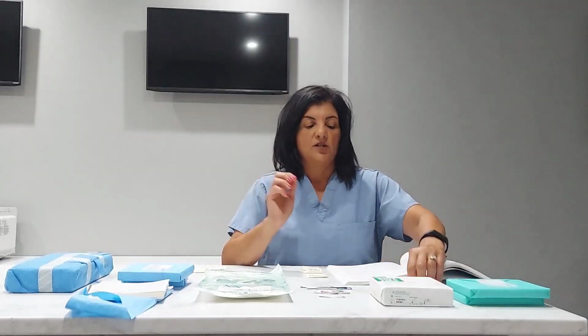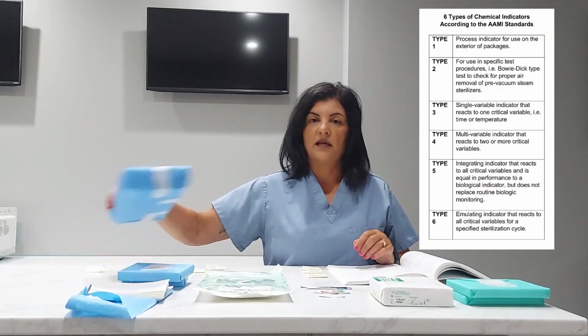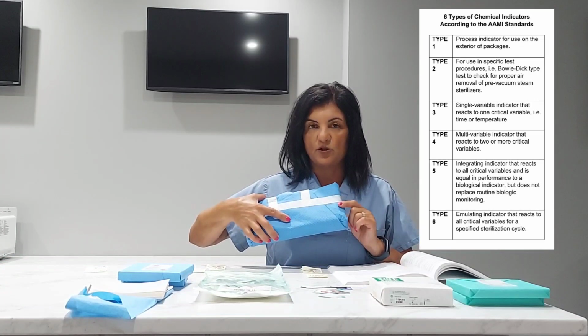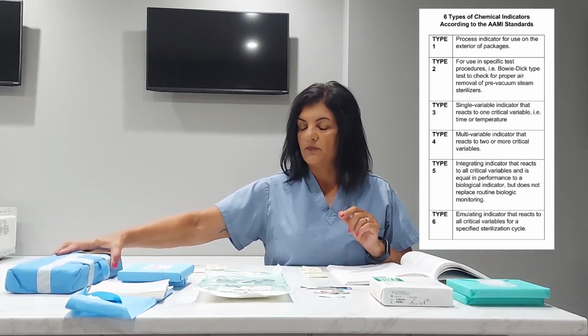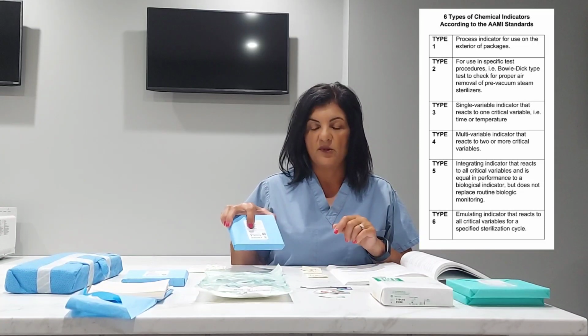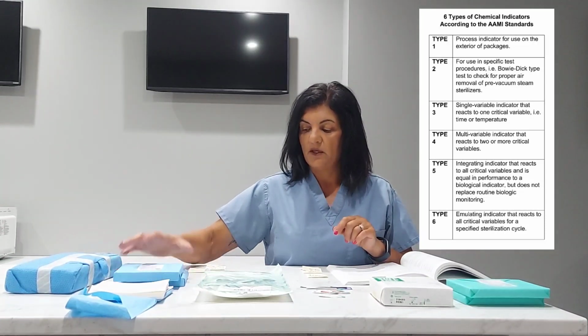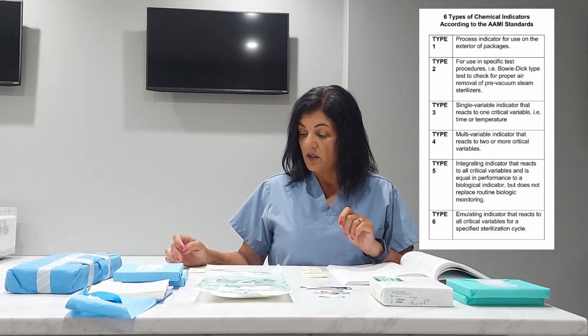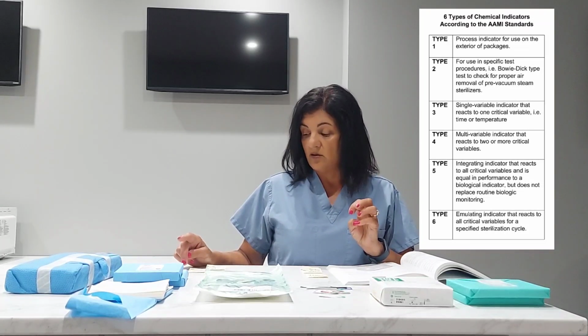So just to review, class 1 is your external tape, exposure to one of the 3 parameters. Your class 2 is typically a test of some sort. Class 3 is designed to react to one of the 3 process variables.